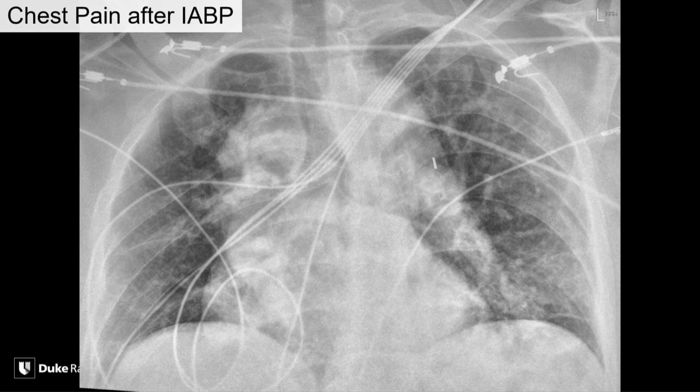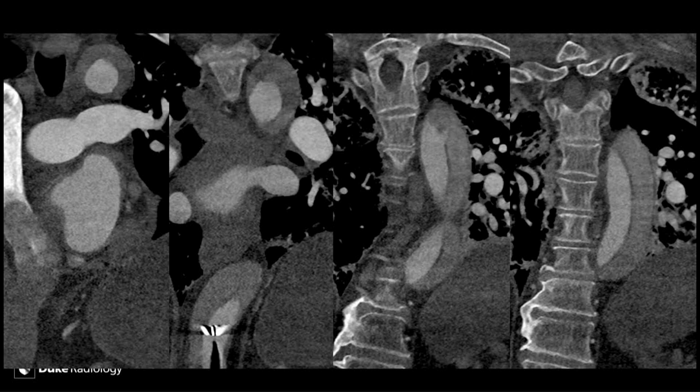And because of the ongoing chest pain and the widening of the mediastinum here, a CT was performed, and you can see that they have a dissection. And there's actually the entry tear, which I think is probably right where the tip of the aortic balloon pump was. At this point, they had retracted it more inferiorly, probably a direct intimal injury with a dissection occurring secondary to the intra-aortic balloon pump. Okay.